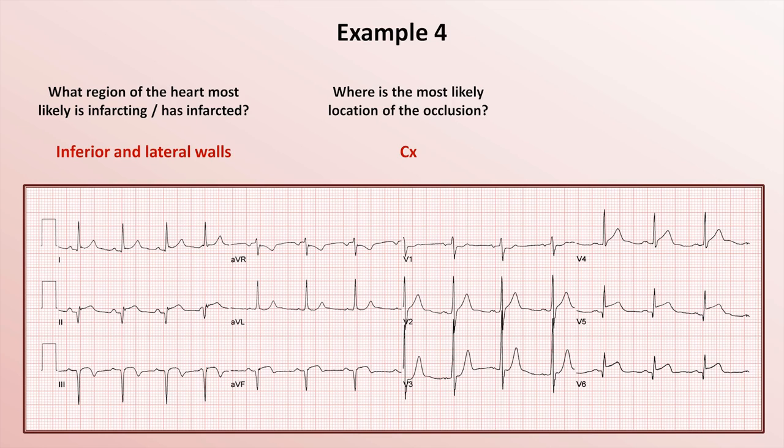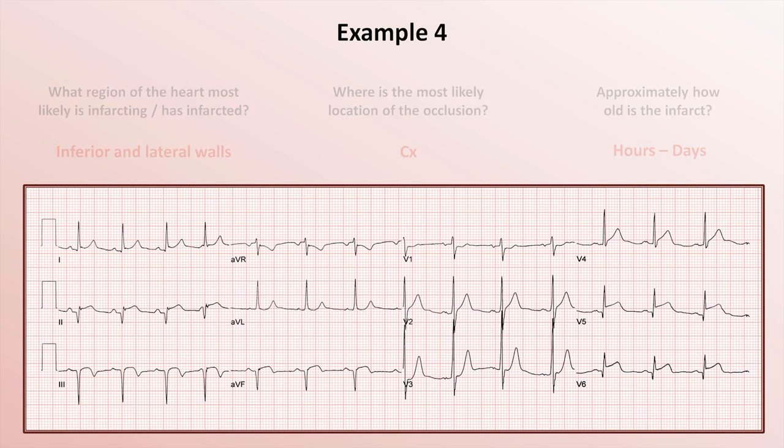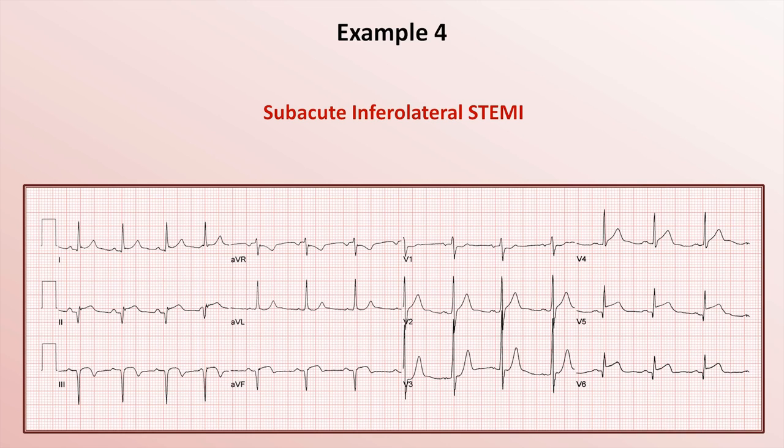As with example 2, we see both Q waves and ST elevations in the inferior leads, meaning the infarct is hours to days old. So in summary, this is a subacute inferolateral STEMI.